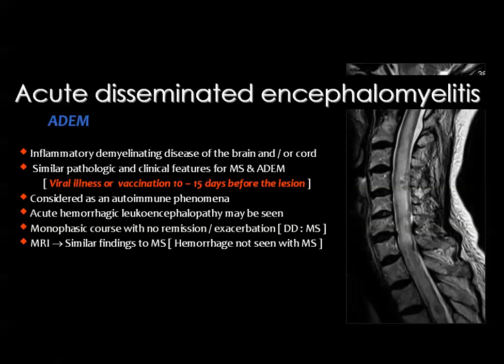They said that this is accepted if it occurs within the year of developing the disease, meaning that within 12 months the disease may show some remissions and exacerbations. But the MRI findings are almost similar to the appearance of MS.